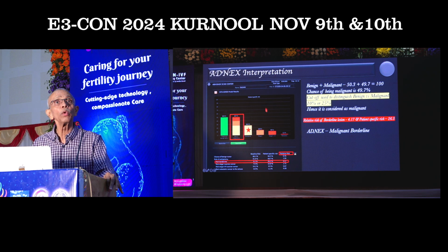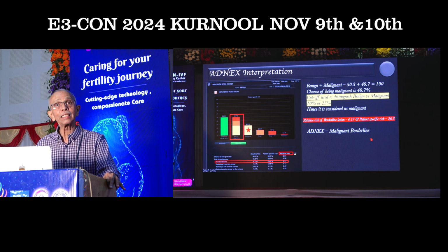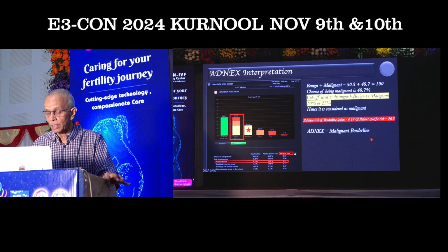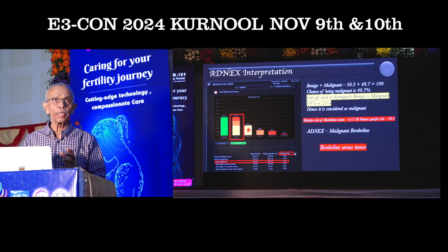So this is how you are going to interpret this ADNEX model, and the ADNEX tells us that it is a malignant borderline lesion, and this turned out to be a borderline serous tumor. So this is how you are going to use the ADNEX model in your day-to-day practice.